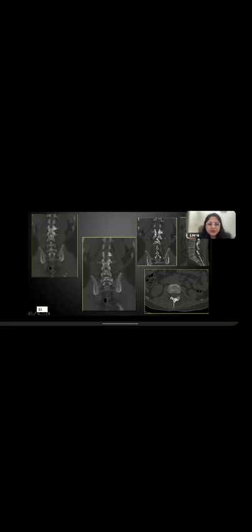33, osteoblastoma. Okay. Why osteoblastoma? If the size of the lesion is less than 1.5 centimeters, still consider osteoid osteoma. If it is a larger lesion, osteoblastoma is a possibility. Okay, so it's in the vertebral body and the posterior elements, and what you can see on CT is the nidus also present. So osteoblastoma and osteoid osteoma both are possibilities. If it is a smaller lesion, osteoid osteoma. If it is a larger lesion, osteoblastoma.